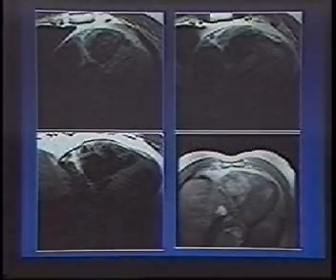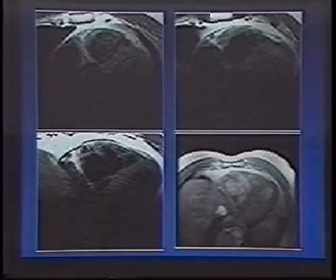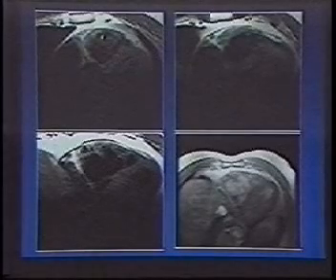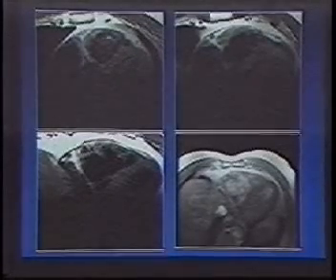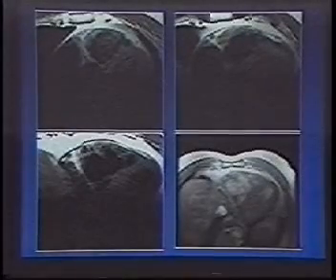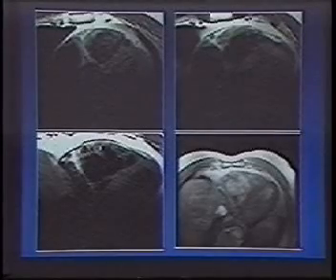Okay, so what do we see? We see in the right ventricle this area of fat in the right ventricular myocardium. The myocardium should be homogeneous like this, but there is a high signal intensity area, and there are other little dots of high signal intensity in the RV. In addition, there's marked wall thinning in various areas of the right ventricle, such as here and here.